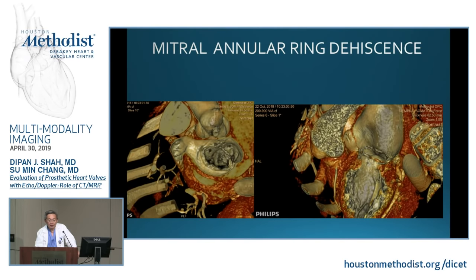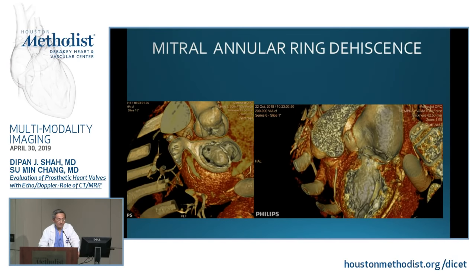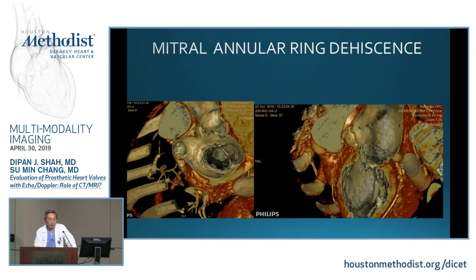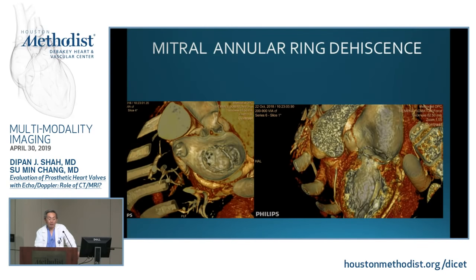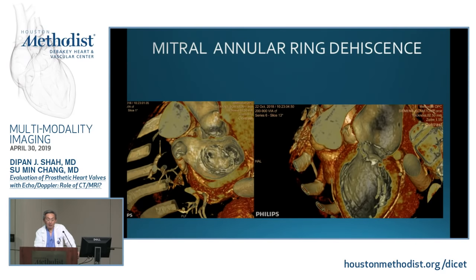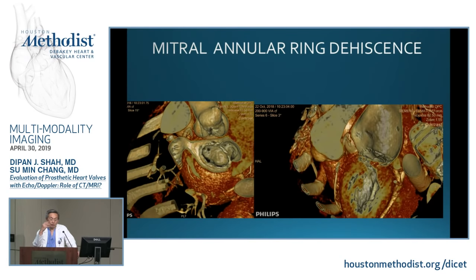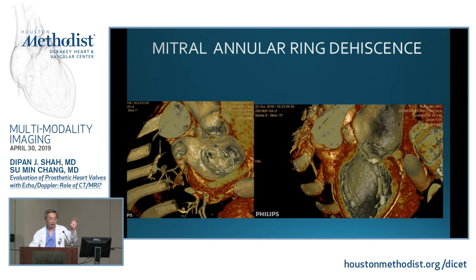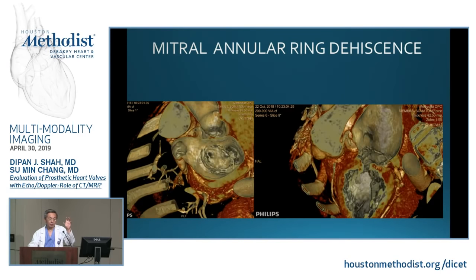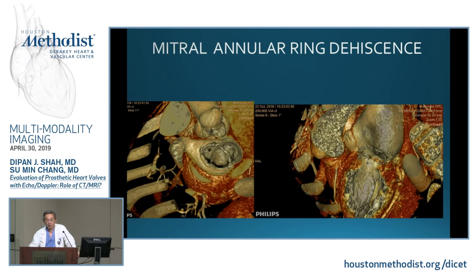It's not leaking. The regurgitation is not due to the dehiscence, because the ring didn't work. We had a beautiful case, I should have put it there, a patient with a posterior infarction and a huge aneurysm. So it was an ischemic MR, and they put a ring, and 2 years later, you can see during CT the posterior wall being pushed out during systole, and that's the area where the ring dehisces. So the regurgitation is still the original regurgitation. It just happened to go around the ring.